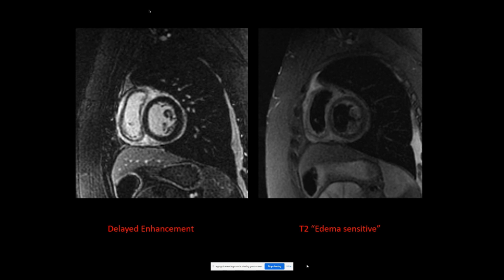Super interesting. Phil, that T2 sequence, that's super sharp. Are all your images looking that good? All your T2 images? They've gotten better, actually. They're better than this now. I think this is just, I'm not paid by anybody, I think the GE scanners, in our experience, tend to have much better T2-weighted images than Siemens scanners in general.